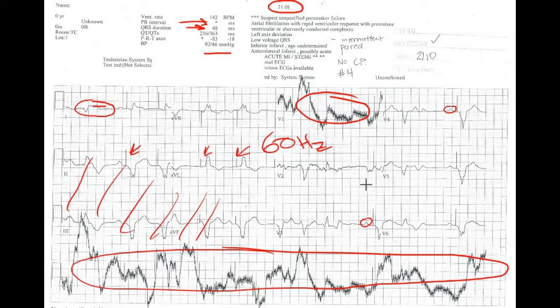So do we have anything else we can point to for that last question of ischemic changes or not? Well, V1, 2, and 3 are the places that we look for that Sgarbossa stuff when it comes to paced rhythms, and I don't really have a very clean segment here. So again, not a great 12 lead to go off of, but the doc in the box is ready to make its call of STEMI, and the doc is ready to make their call of no STEMI.